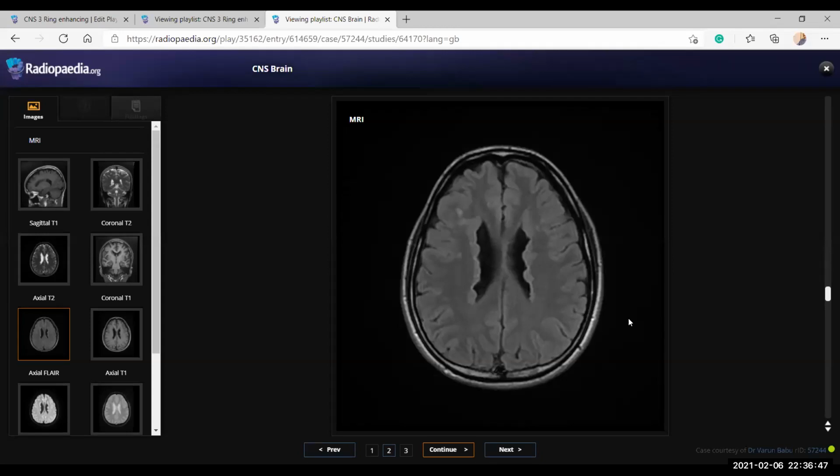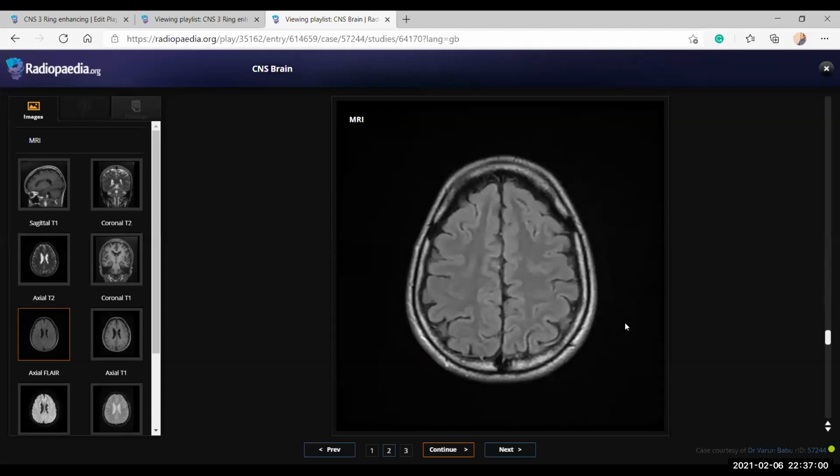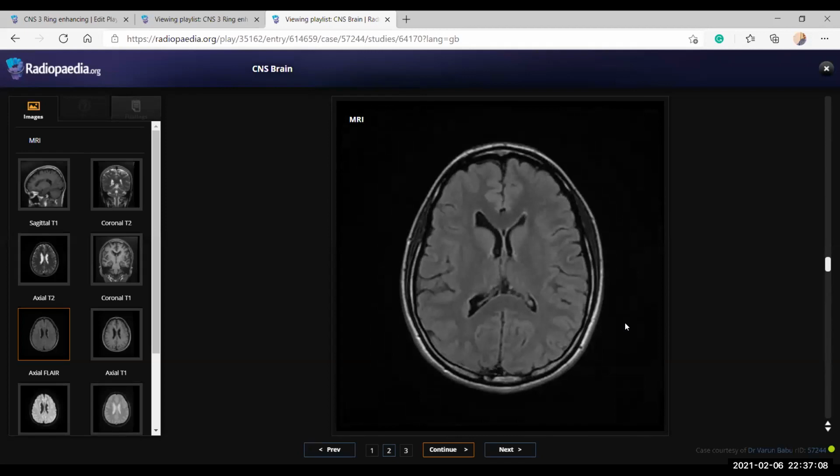Okay. So you are diagnosing heterotopia? Yes, subependymal heterotopia. Okay. So what are the other types of heterotopia? Band heterotopia and other cortical dysplasia. Okay. So you did well. So there is no need to discuss. I think you told all the findings.